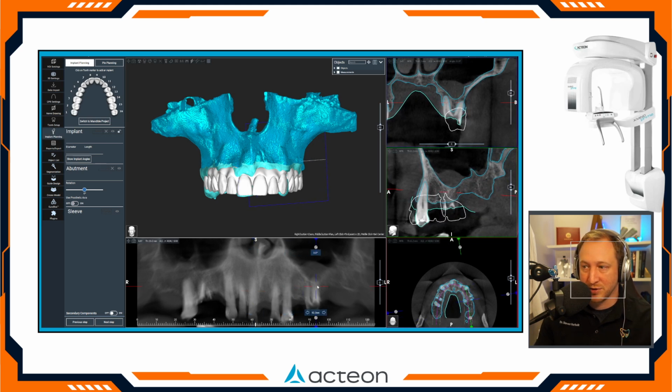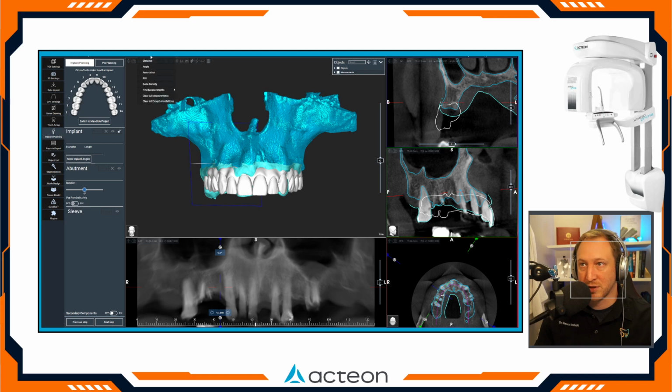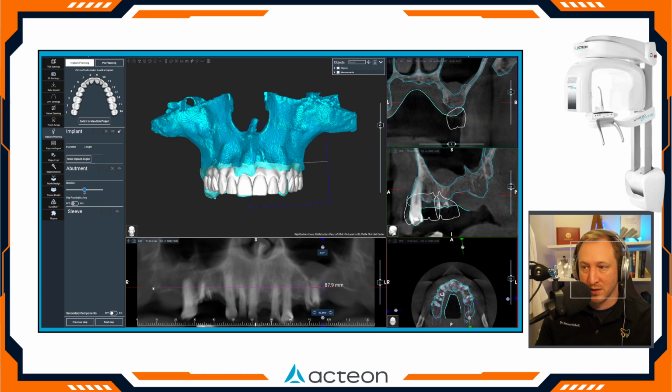It typically goes just shy of the sinus if there's a pneumatized sinus, and it goes right across. So I'll just draw this out for our own visualization. It's going to be something like this. Okay, we saw Don's photos. He shows a little bit of gum in his smile, but I wouldn't call it a high smile by any point.